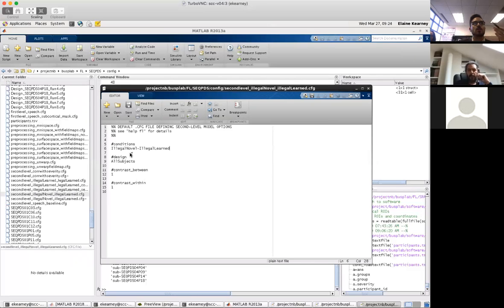Perfect. And do you want that... Like I envision that we would do both of these contrasts overall for all subjects, and then examine each individual patient and control group separately. Okay, that makes perfect sense. And so without any reference to severity, we'll get to severity later.